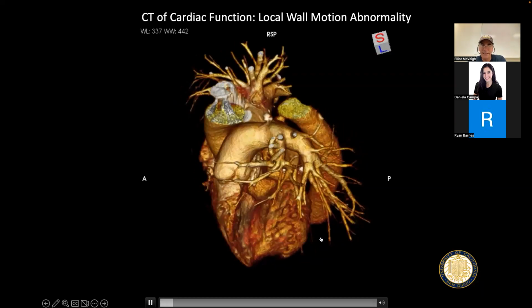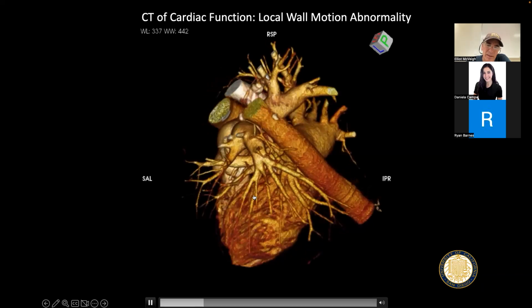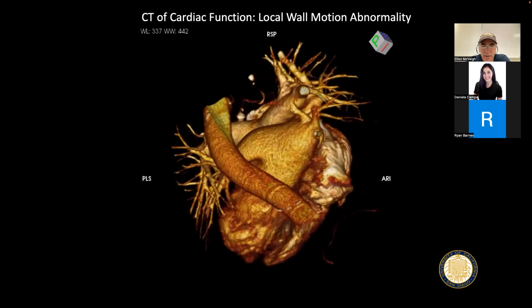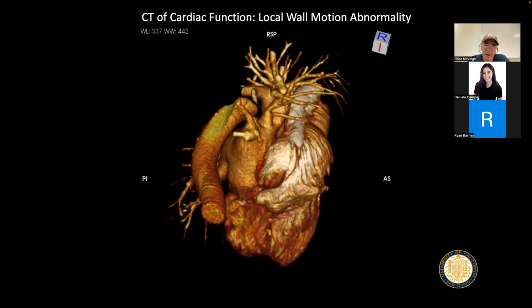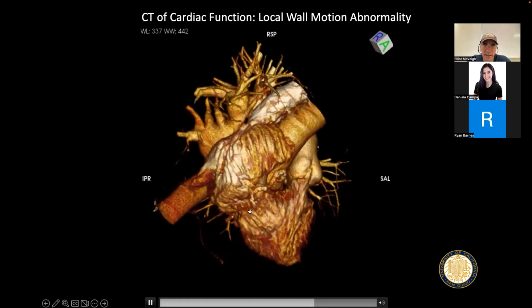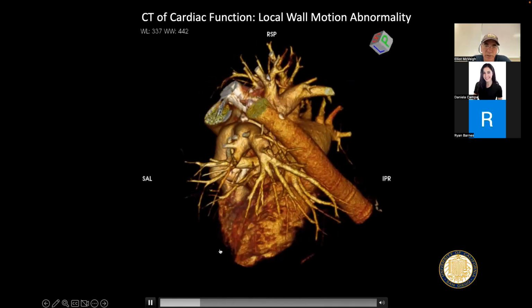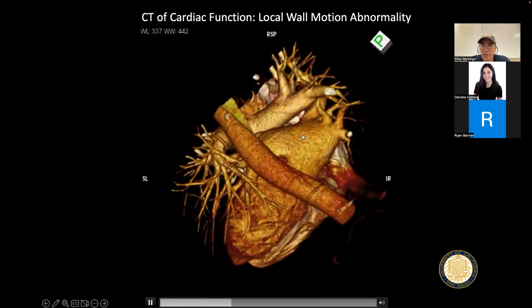All right, so where we ended up was looking at this 4D data set, in the sense that we have about 10 volumes over time through the heart cycle. Each time frame that you see here represents about 160 milliseconds of data. When you play those volumes back to back, you get a dynamic view of ventricular function, which is here, for example, and atrial function, which is up here.